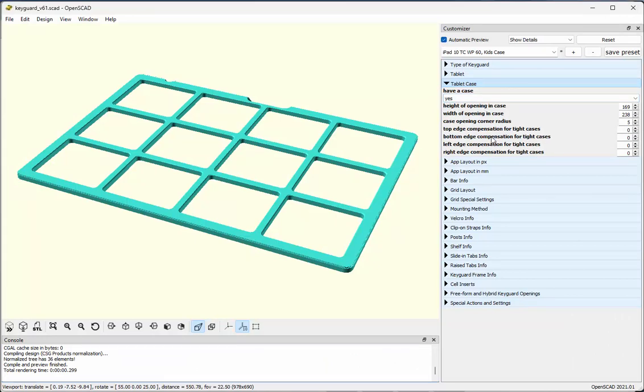And I can go right now and save the entries I've currently put in the designer just by clicking on this button to save any changes I've made to the preset. I know there are changes because I see an asterisk right here. So I'll save these changes.